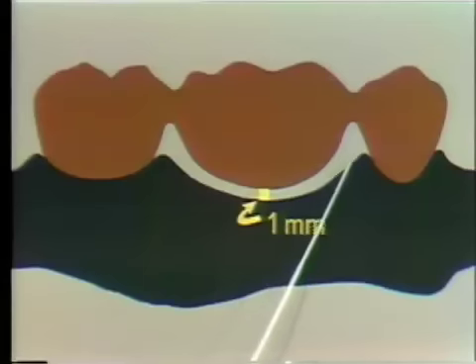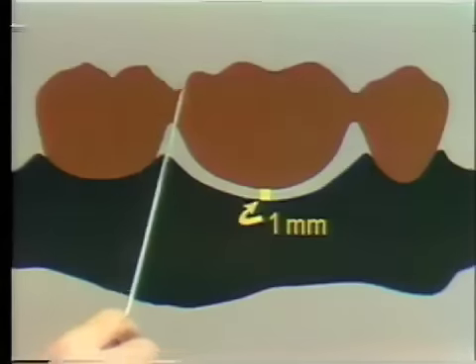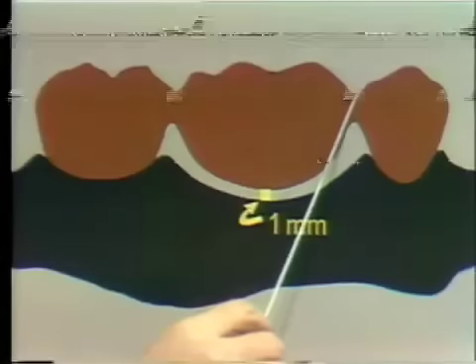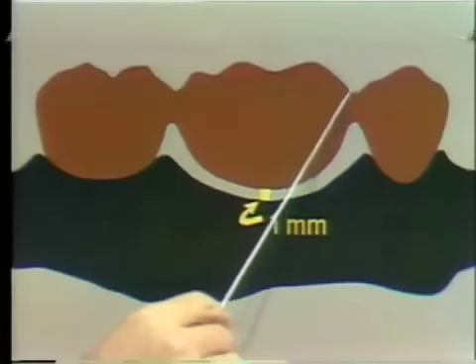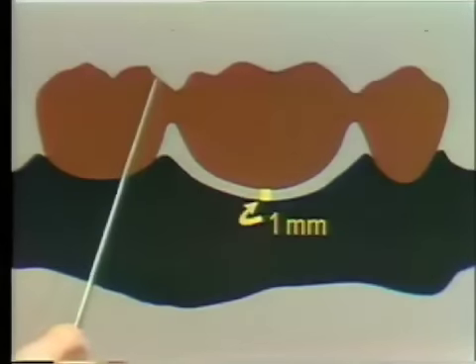the mesial here. It also shows another point which we've not yet covered, and that is in developing an adequate occlusal embrasure in these surfaces here, where the distal marginal ridge of the bicuspid finishes, drops down, comes to the connector, and then rises again to a marginal ridge on the mesial of the molar. You see the same thing on the distal surface here.